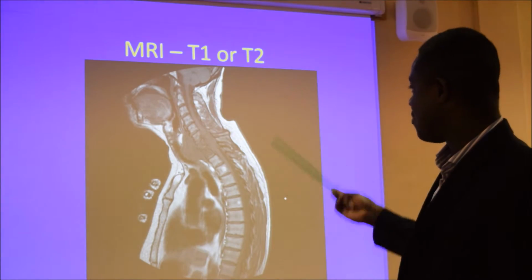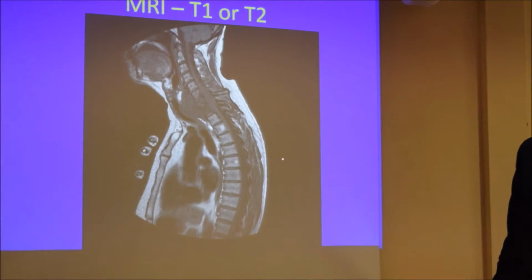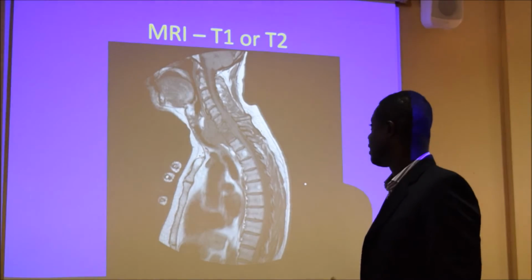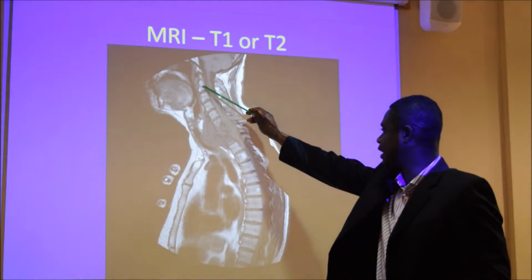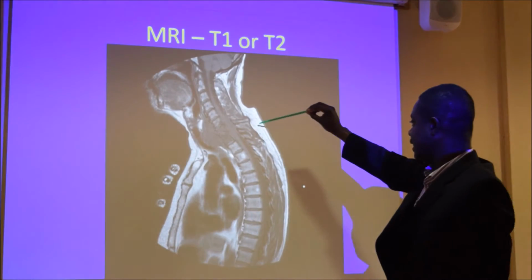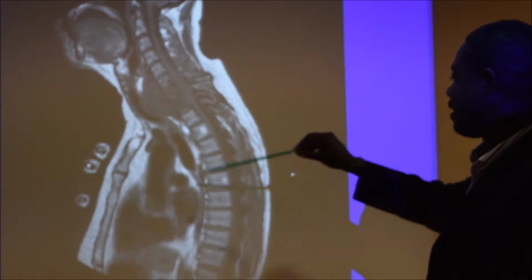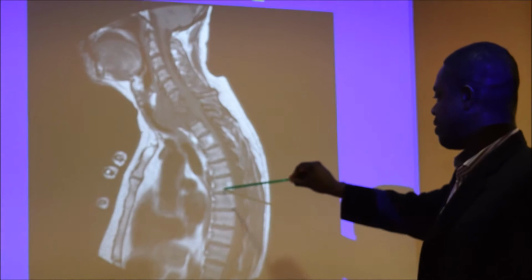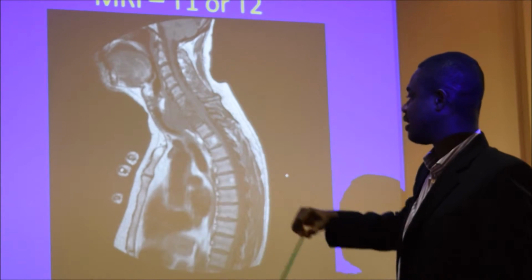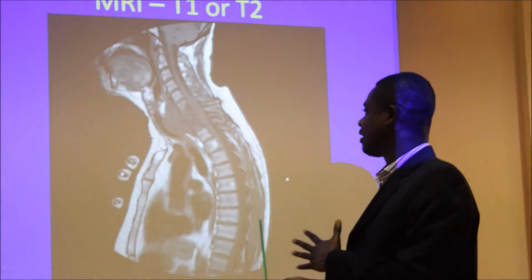All right, with MRI, we talk about signal. So just a quick recap. Ultrasound, we talk about echogenicity. CT scan, densities. MRI, signal. So with MRI, we talk about signal intensity. So that would be a high intensity MRI, intermediate intensity, and then low intensity. Okay, and there's several things that cause so-called low intensity, several things that cause so-called high intensity.